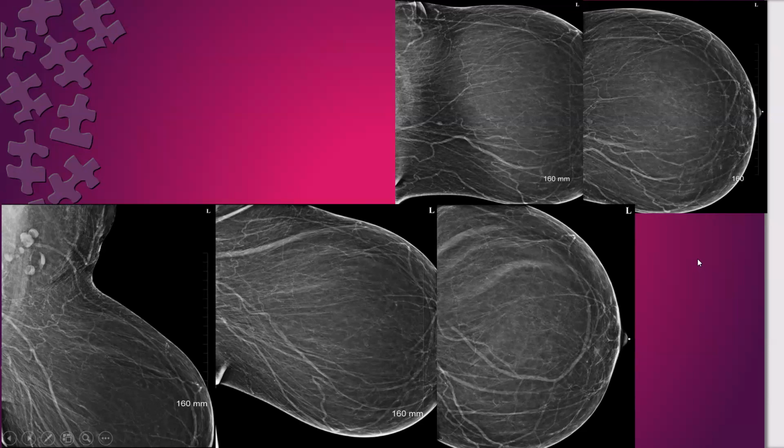The scan is not covering the whole breast. Large breast. This is not only large. This is a huge breast. Yes. You see, the MLO was examined in 3 images to cover the whole breast.